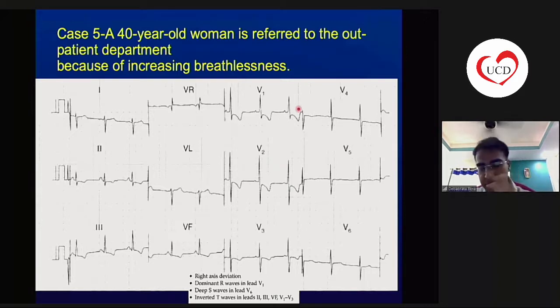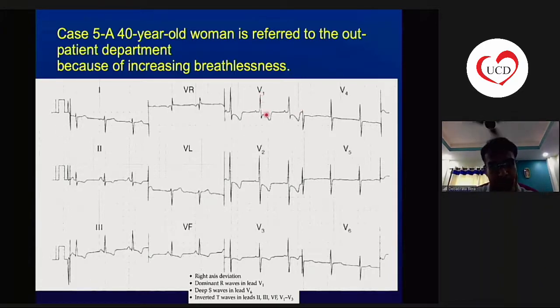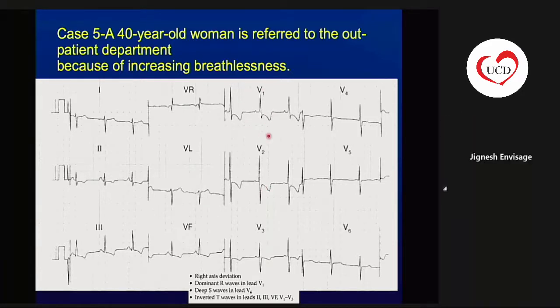It can be secondary pulmonary hypertension as well, where the patient can have COPD and can have such a prominent QRS complex in V1 along with ST depression, like we find in LVH. This is a sine qua non for right ventricular hypertrophy.